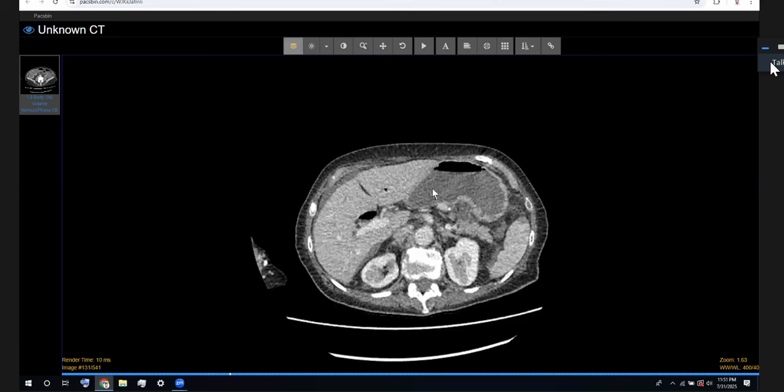But anyway, if you saw these findings on an X-ray, this would be termed Rigler's triad, wouldn't it? Have you heard of that? Rigler's triad? What is Rigler's triad? Rigler's triad includes pneumobilia and small bowel obstruction and an obstructed ectopic gallstone. Exactly that.